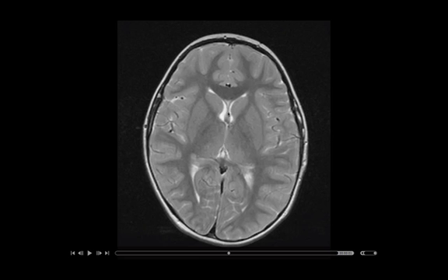Now I just want to mention that there are two different shades of color in the brain in this image. The lighter shade of gray is the gyri. The gyri are made up of the gray matter. So all this, the lighter shade, is the gray matter, and the darker shade here is the white matter.